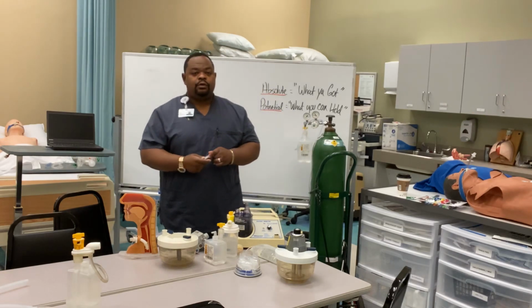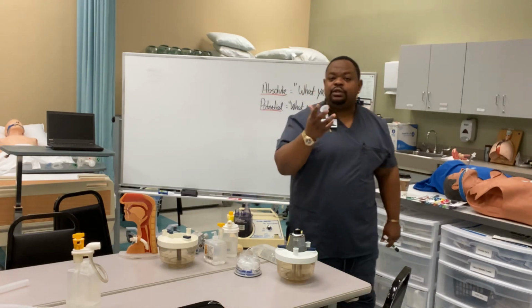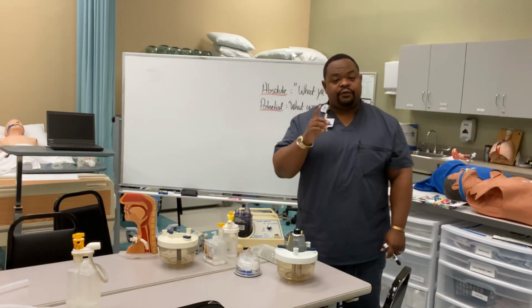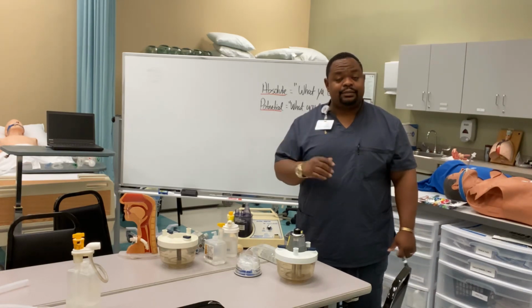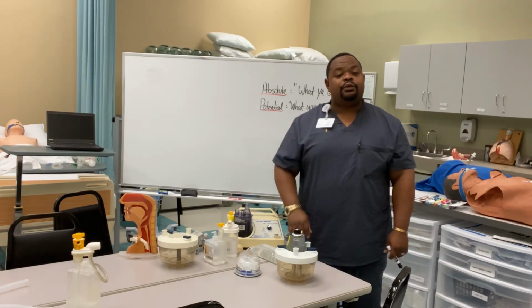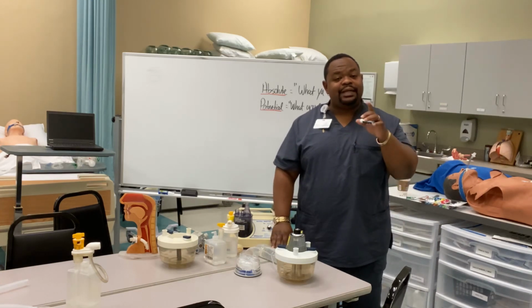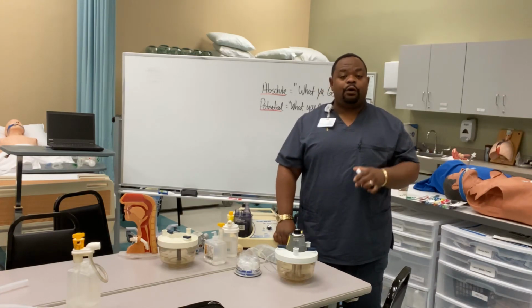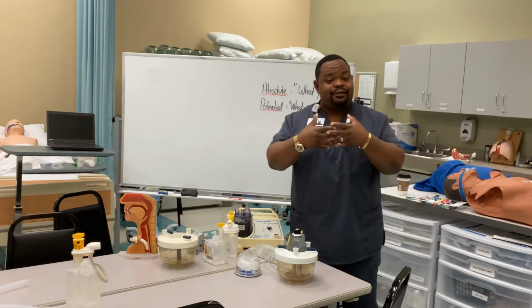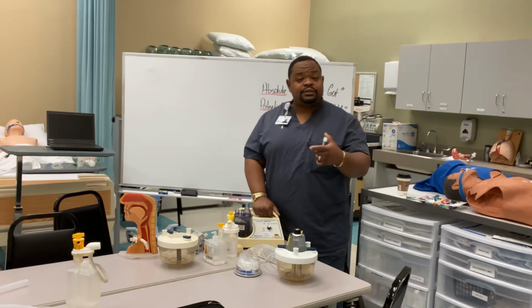All of these are on the test. All of these concepts you will need to know as a respiratory therapist. Very important. Aerosol you can see, humidity you cannot see. Humidity is just a vapor, right? Make sure you study your indications of why we give humidity or why we would give aerosol, right? Know the difference between the two. Even though they mesh together, there are some differences between the two. And there are going to be some contraindications, right? Some contraindications of too much fluid, right?